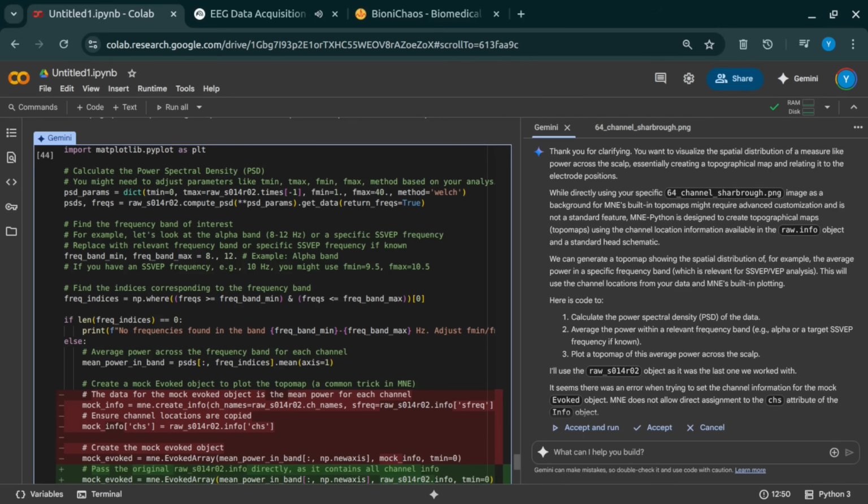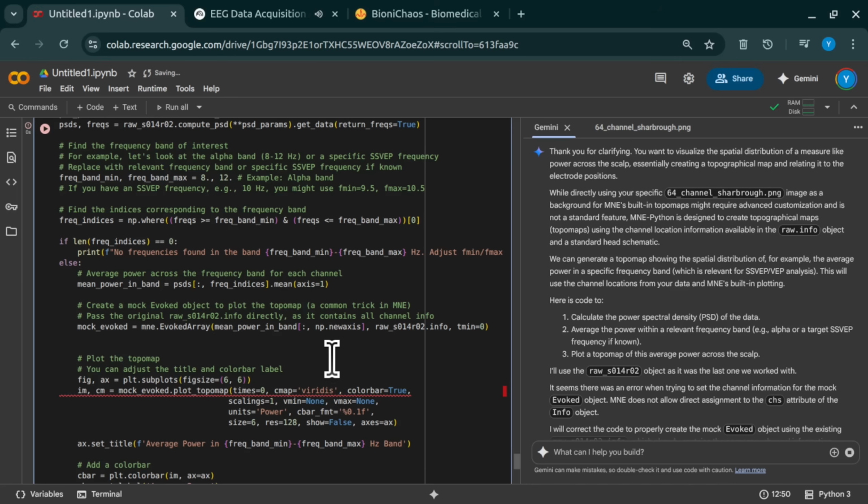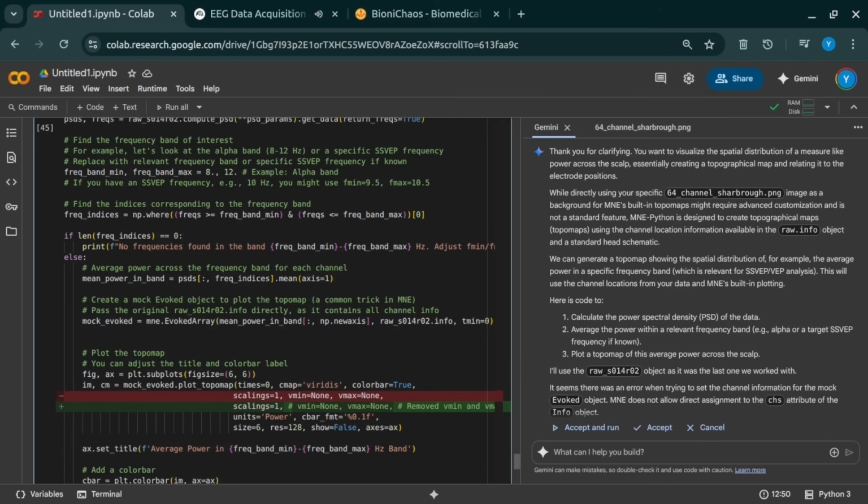Not text then. Well, we tried rereading it specifying a different encoding, Latin-1, which sometimes works for unusual text files. Still no good. Looking closer, the file was full of mojibake, non-printable characters. It wasn't text at all. Binary data. Looked like it. A custom binary format, which means you can't just open it like a notebook. You need to know the specific structure, how the bytes are arranged, what they mean. Exactly. It requires custom code to parse it. You need the key, the specification for that format.